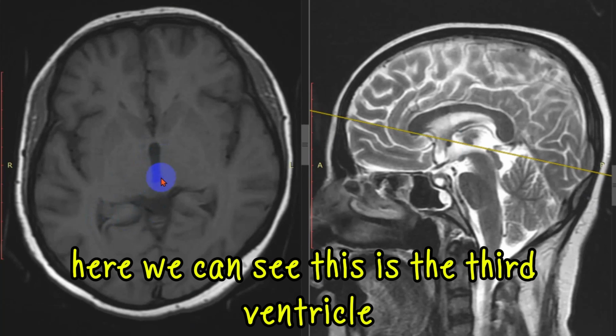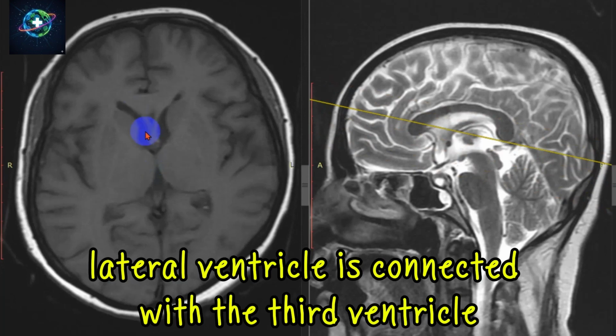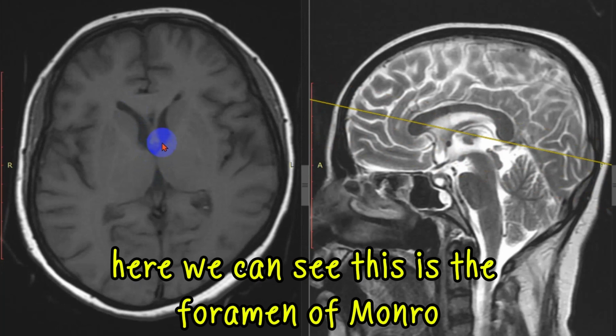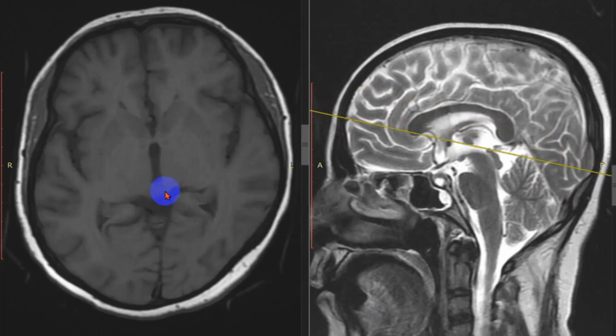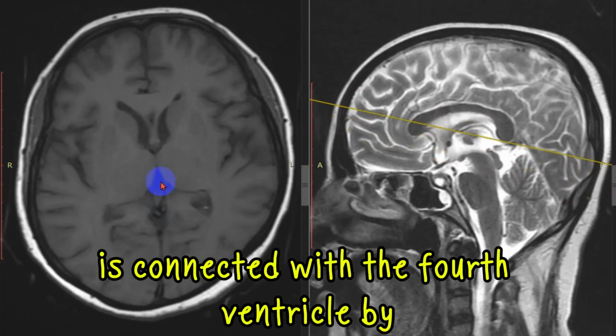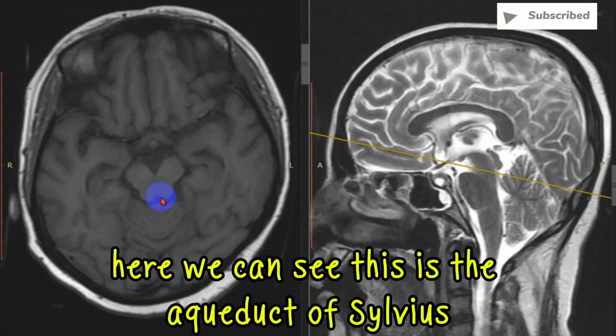Here we can see this is the 3rd ventricle, and the lateral ventricle is connected with the 3rd ventricle by the foramen of Monro. Here we can see this is the foramen of Monro, and the 3rd ventricle is again connected with the 4th ventricle by the aqueduct of Sylvius. Here we can see this is the aqueduct of Sylvius.